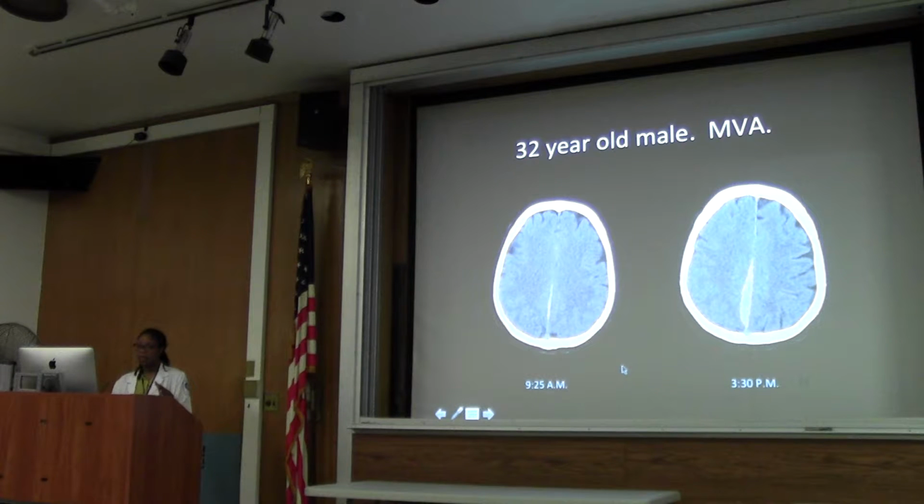There is some controversy about how to manage these patients, because certainly no one's going to drain this, but the patient warrants some clinical observation. So again, be very careful along the falx to look for those subdural hematomas. You can see here the normal region of the falx anteriorly is very thin, and even back here it's very thin, but when you come to this region, it's a bit thickened and brighter than usual. So that's what a subdural hematoma looks like.